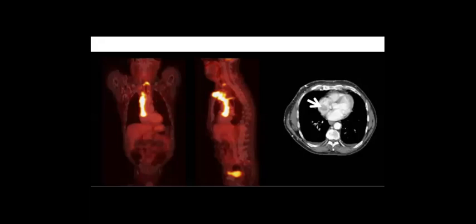No, I mean in this case. I mean in general, you can say any primary here. But in this image, can you find something, Asma, that can help you find the primary? So this level of what? I see, maybe Nermeen, yes, tracheal. If it is not the trachea, what do you think? What will be the structure? Yes, Rabab, thyroid. So it will be thyroid.